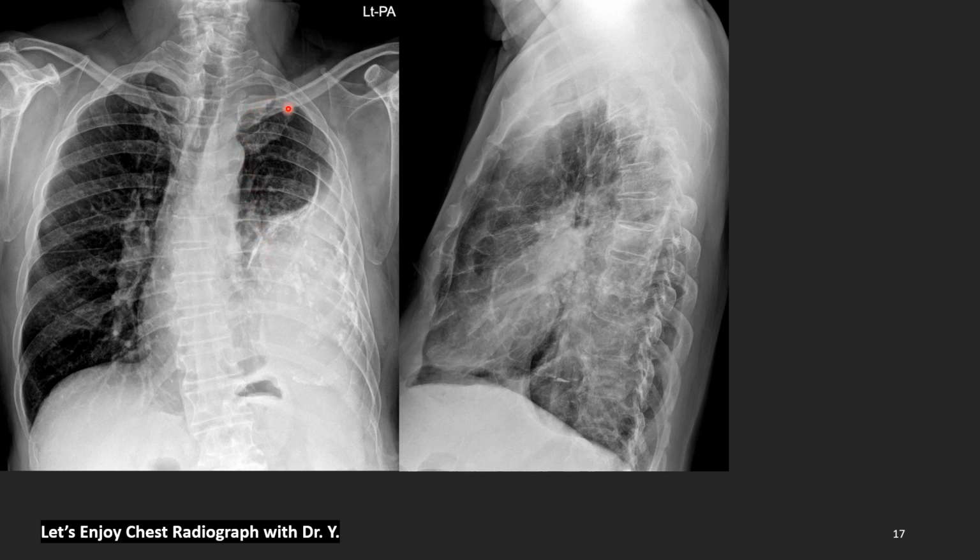At first, left side thorax is smaller than the right side, normal side thorax, and intercostal space is also narrower than the right side. This means this is a chronic process with shrunken left side thorax. And we see in the left lower lung zone thick inner surface of pleural calcification and lateral calcification with inside calcifications. On a lateral film, we also see this same linear outer side of calcification and calcification everywhere.